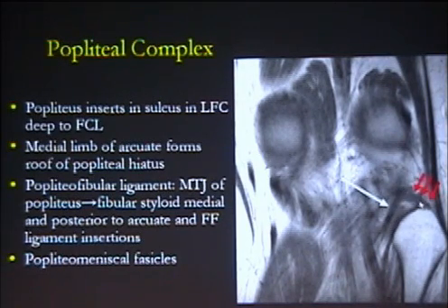If you see something coming off at about 90 degrees from the popliteus tendon heading down toward the fibular styloid, that's the popliteofibular ligament. I have it outlined here with the red arrows. Note the insertion. Fibular styloid process right here, medial to the fabellofibular, arcuate, and fibular collateral ligament. So it's medial over here, kind of sits right up there on the fibular styloid process.